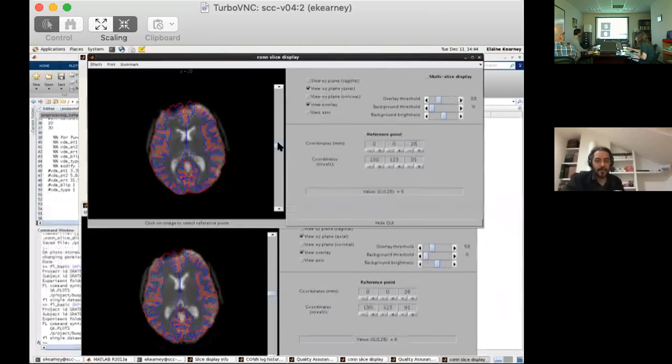One of the key places you can tell is the ventricles, the white ventricles, the more interior ones up above, right there. If you go up from there, you can see that on the top one the lighter voxels of the functional data are posterior to where the blue white matter surface line is, whereas it's a much better match on the bottom. Right, yep, I see. There's still, yeah.